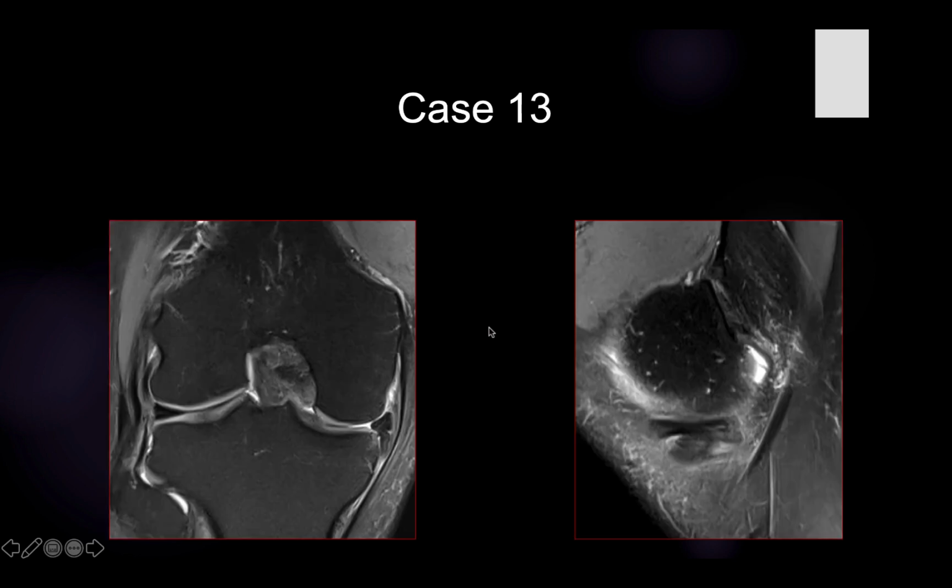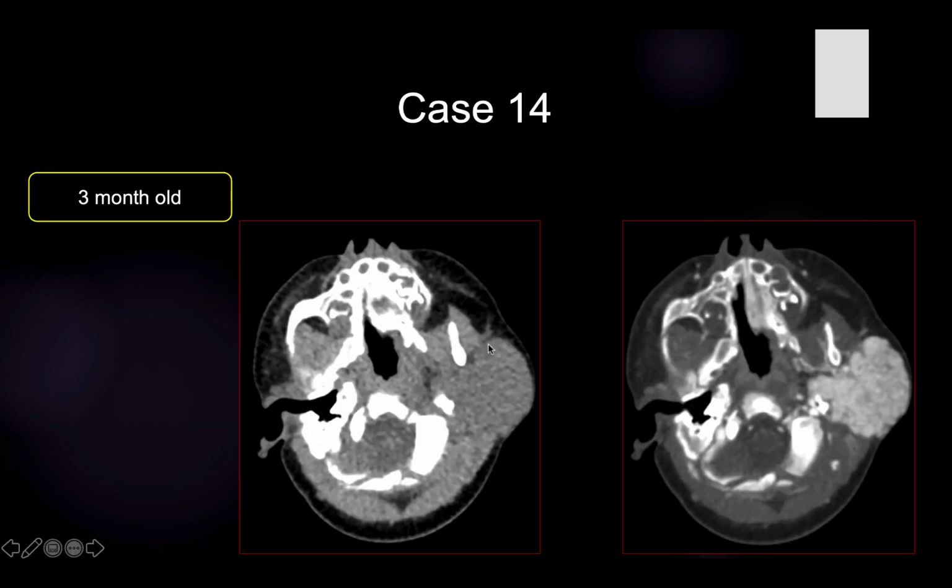In this case there is another example of a displaced meniscal tear, in which there is blunting of the body of the medial meniscus. This is the body of the medial meniscus. It is blunted here, not pointed, and we can see displacement of the meniscal fragment seen in the inferior recess. This is the meniscal fragment that is displaced here. So this is an example of a flap tear, in which there is displacement of the meniscal fragment adjacent to the meniscus, either into the superior recess or into the inferior recess. In this case, the displacement is into the inferior recess. And again, this is one of the characteristic features of a flap tear of the body of the medial meniscus.